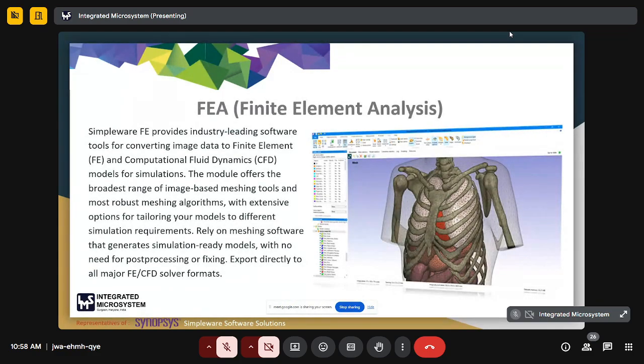Once the segmentation and modeling process are complete, the next step is to explore the result for visualization, design, simulation, or fabrication. Synopsys Simpleware supports an extensive range of export formats for various downstream applications. These exports include surface models, volume meshes, and even high-quality images.